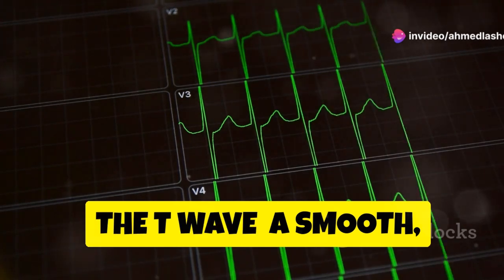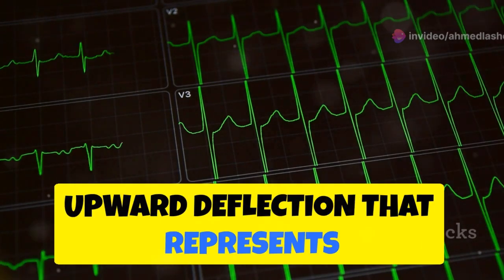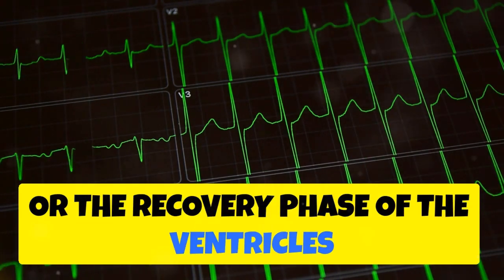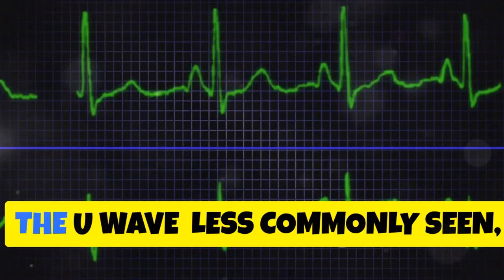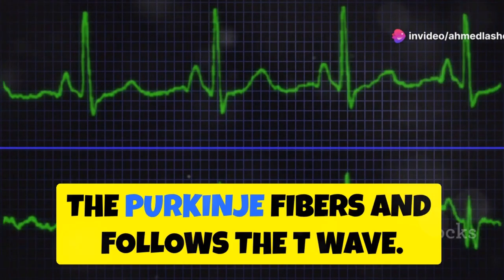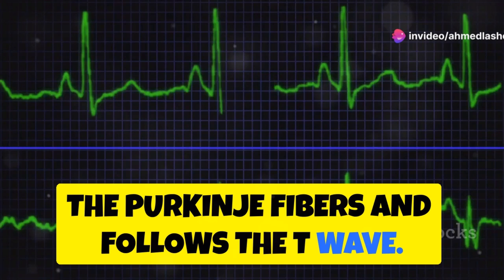The T wave. A smooth upward deflection that represents ventricular repolarization, or the recovery phase of the ventricles after contraction. The U wave. Less commonly seen, it may represent the repolarization of the Purkinje fibers and follows the T wave.